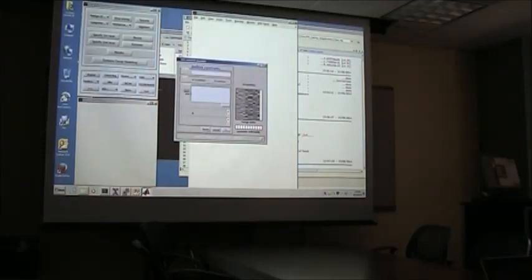So what you could do now is set up a contrast. Again, it's directly related to what I started off the presentation with. You would set up a certain contrast to test for something you're interested in. Say these first two regressors are for non-famous people and these two are for famous people, and you want to see whether there's any difference between non-famous versus famous. You could do something like this.